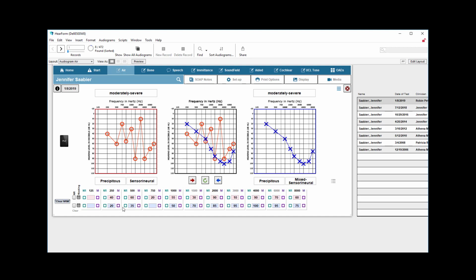That just might be a little bit of time saver for you, but you can manually choose masking for any one of those. And notice the symbol changes in the center only here. So that's just something to keep in mind. If we change this here, then we see a little triangle there. But again, no line is connecting those, which is a little disconcerting, but we are working on that issue.